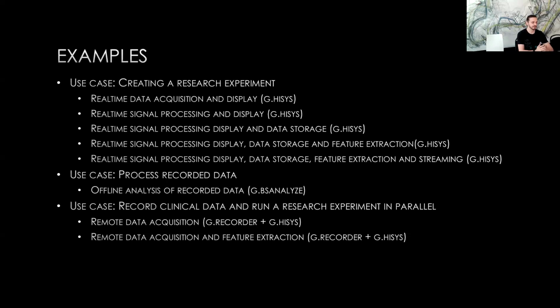The second demo will be how to add some pre-processing so we can process the EEG to look good. Then I'm going to add some data storage and some feature extraction in the next demo. And in the final demo, I'd like to acquire data, pre-process it, store it, extract some features, and stream data to another application.